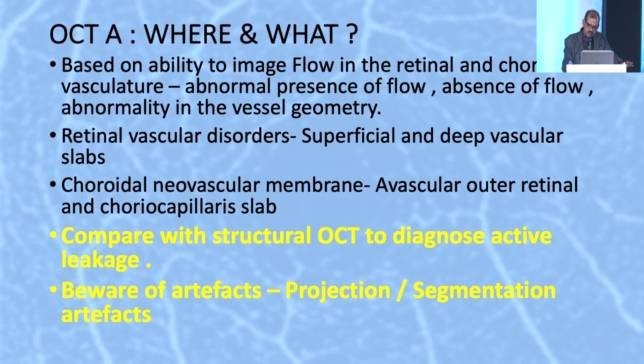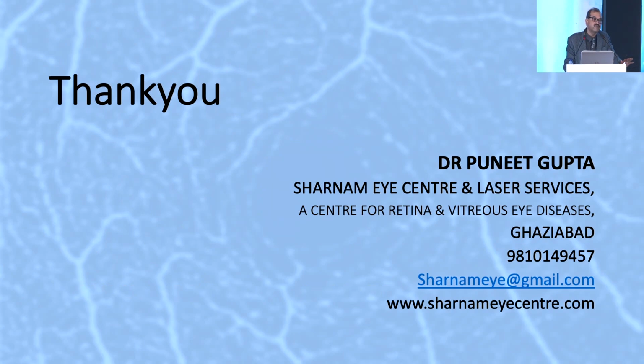You have to understand how the various artifacts will influence your images, so you need to beware of these artifacts. OCT angiography is a useful technology. It is a dependable tool for assessing various retinal disorders.